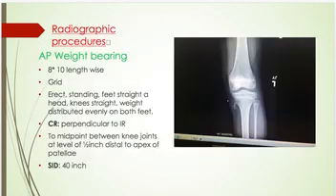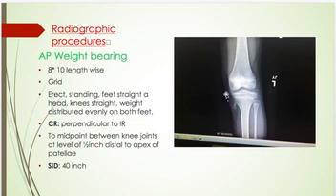For the radiologist report, a skin marker is placed in the medial aspect of the knee in the area of the palpable abnormality. Correspondingly, there is a single pedunculated osteochondroma measuring 13 mm projecting inferiorly from the medial aspect of the proximal tibia. There is no fracture or post-traumatic deformity. The joint spaces are preserved. There is no evidence of arthritis or osteochondral defect.